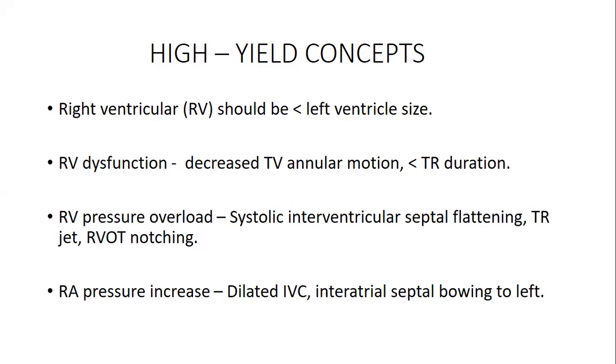And you can also find reduced duration of the tricuspid regurgitation. Other things you have to note is that right ventricle pressure overload may actually cause systolic interventricular septal flattening, and the TR, which is the tricuspid regurgitation jets. You can also find RVOT notching.